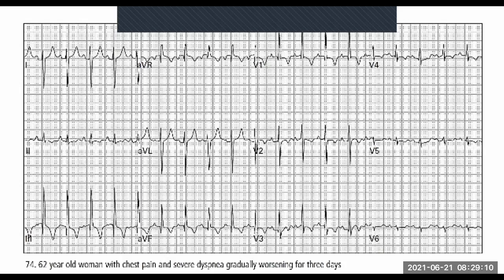And then if we look at the PR interval, we've got 1, 2, 3, 3.5. So the PR interval is normal. We've got slightly wide, I would say borderline QRS complexes, but they still fall within the gamut of relatively narrow, but they are borderline. And we've got a QRS following every P, and we've got everything happening in quite good rhythm. So except for the type of P wave that we've got, we do have a relatively normal rhythm, but that P wave is quite a big clue as to what we already have. Okay. And like we say, we've got a tachycardia. Technically, we've got a sinus tachycardia.